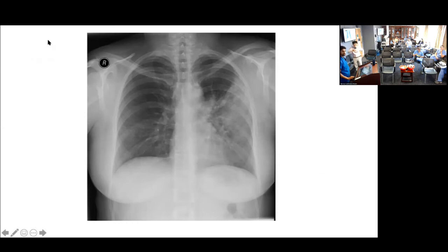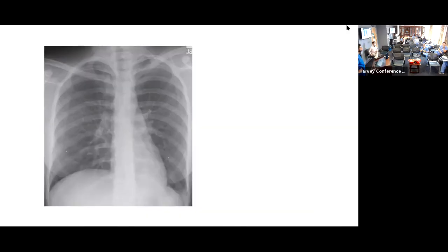Oh. So this is a retrocardiac opacity, where you're not able to trace the left hemidiaphragm all the way. You should actually be able to trace them all the way through, even behind the spine, the air bronchograms, and then you're missing the portion of the left hemidiaphragm that's behind the heart. So that's the left lower lobe retrocardiac pneumonia.